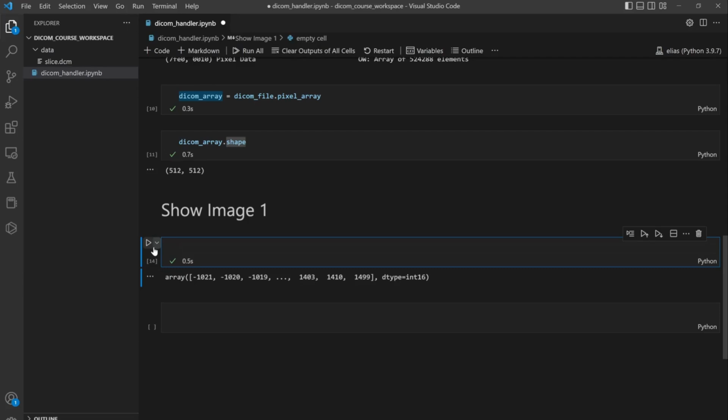The first thing, as we said, is we have the DICOM image, which is this one. Before doing anything, we need to convert this image into float, because if we leave it as integer and divide it by a maximum or a minimum, or by anything else, it will always be an integer.